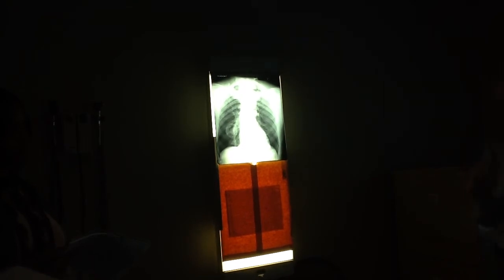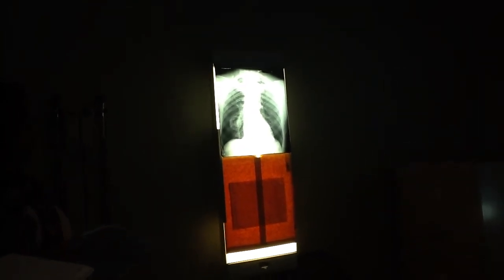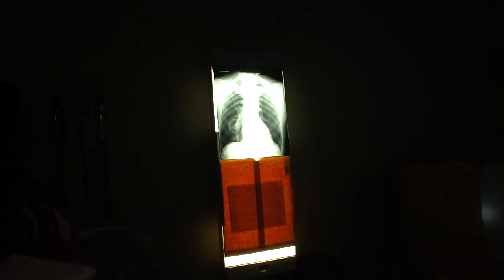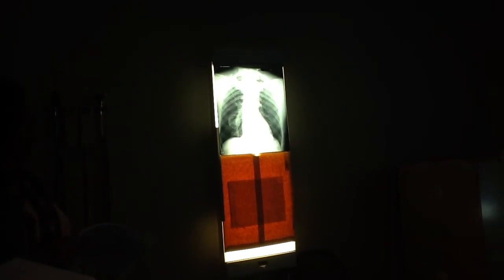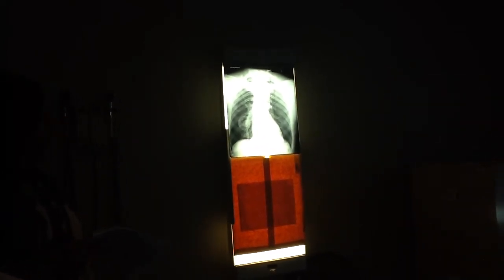And one of the things that's unique to tumors, because it's cellular and solid, is it may incompletely cavitate. I mean, part of it may become necrotic, and part of it's not. And so the thing doesn't hollow out completely. It may only partially hollow out. That's why we've kind of got this density right in here, which looks kind of like something inside the cavity, doesn't it?